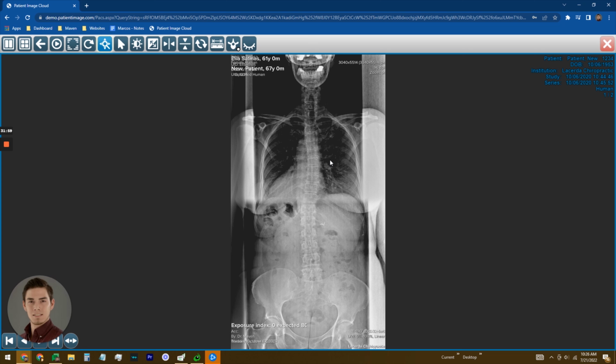And that about wraps it up. So today we have gone through the chiropractic tools of the Patient Image Cloud software.